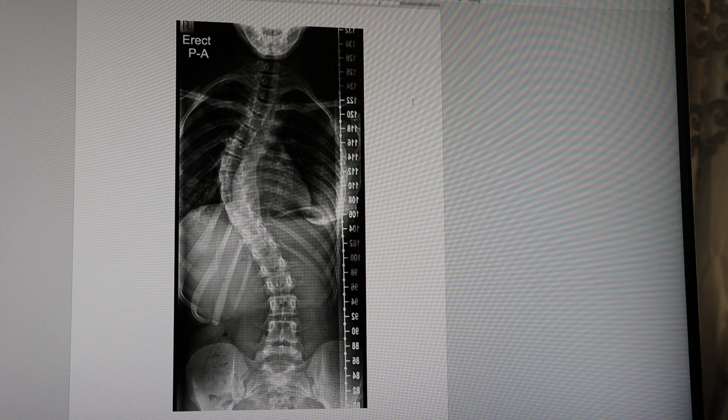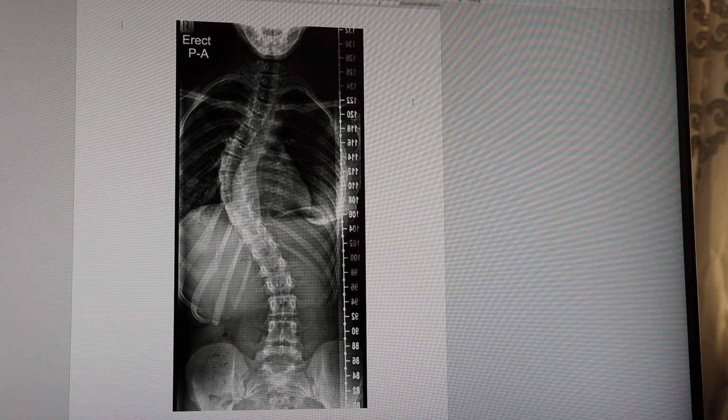Now, whilst the patient is lying supine, let's say that the patient has undergone a CT scan or MRI image. Now, CT scan for bone visualization, so the patient is supine, and this will lessen the degrees of scoliosis. So when we want to identify the actual degree, we go for the X-ray erect standing image.